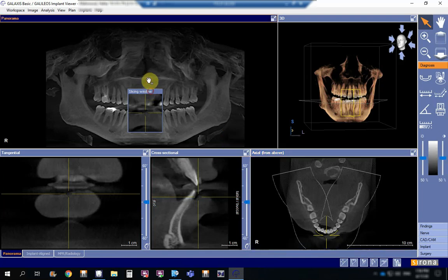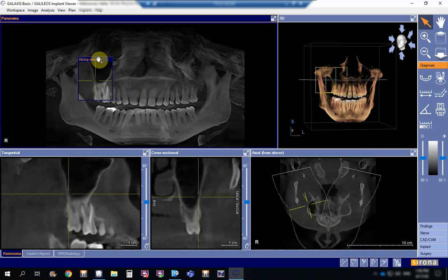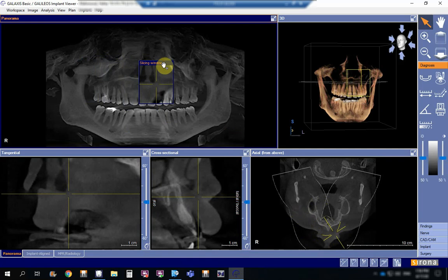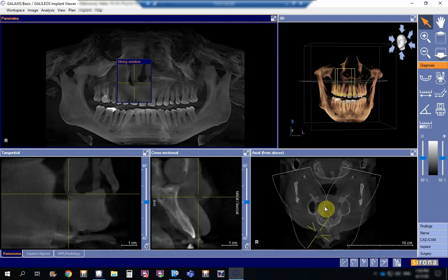that instead of going through the panoramic view to have a general look at the patient, we would go through the axial view. In the axial view, the axial view in fact gives you the chance to navigate through the different layers in a cross-cut section.